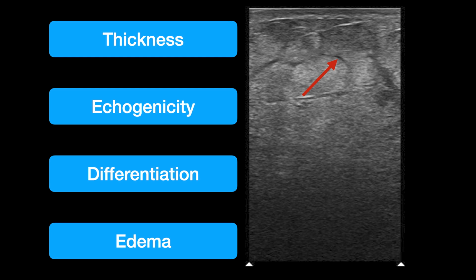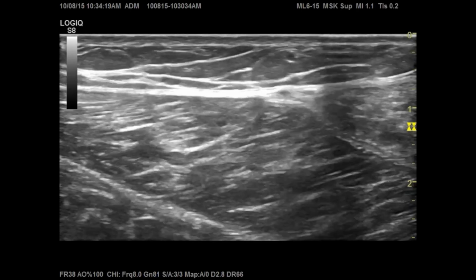So your CHF patient with bilateral lower extremity pitting edema is going to look similar. Your lymphedema patients are going to look similar. Your cellulitic patients are going to look similar. And this is where it does come down to a little bit of correlating clinically, because the story is going to have to drive how you interpret this study, right? So with that aside, this is an example of just normal tissue.